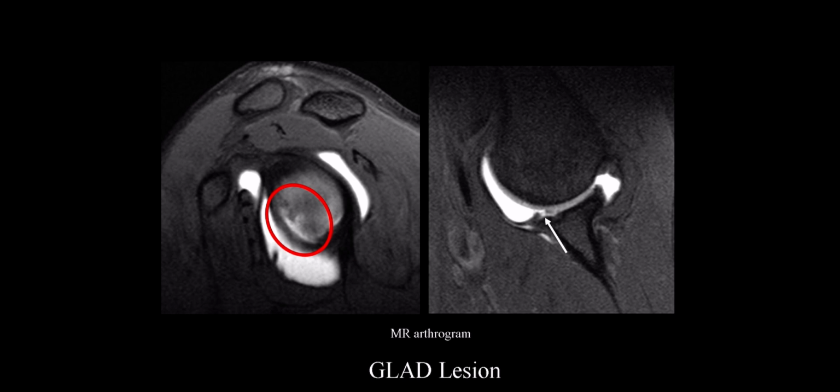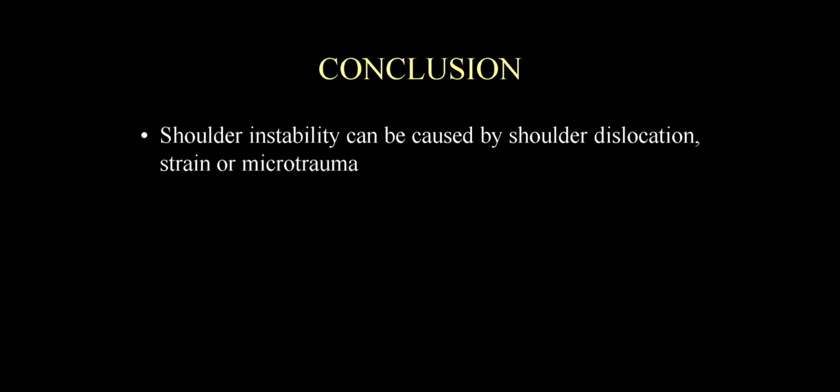If you look at your sagittal image, you can get a whole lay of the land, how much of this is truly involved. Because you want to make sure you give the surgeon and the patient a realistic view. If they go in there just attempting to repair the labrum, it's not going to solve the issue of extensive cartilage damage. So try to quantify that with centimeters if you can.